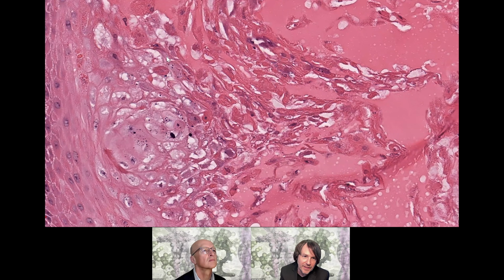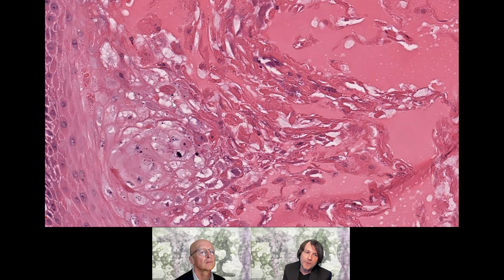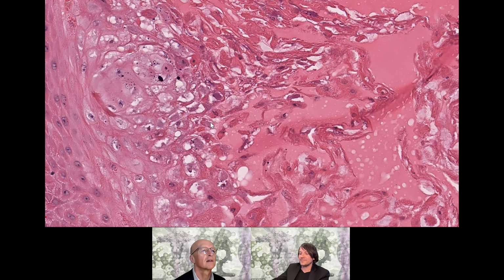Oh, there, perfect. You found the area. Good job, Artur. It's not your first rodeo. Well, it's more a matter of luck.